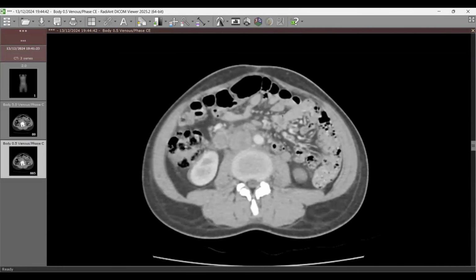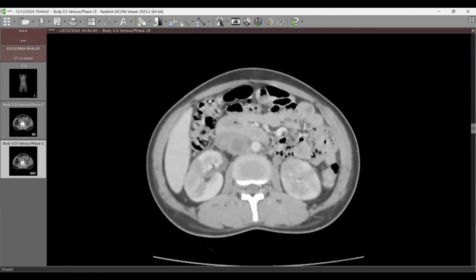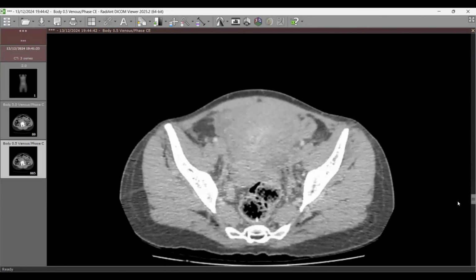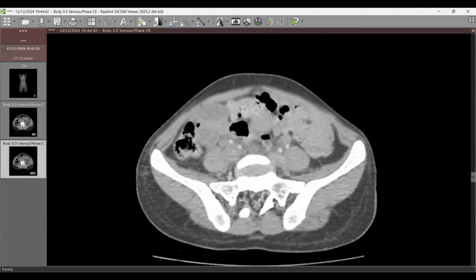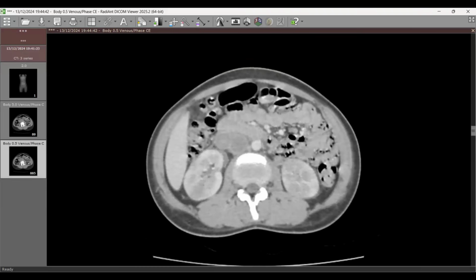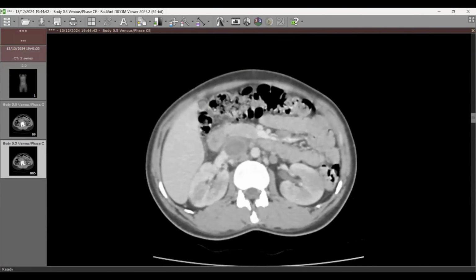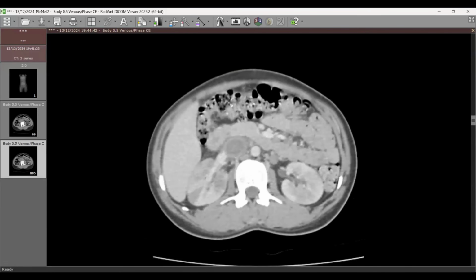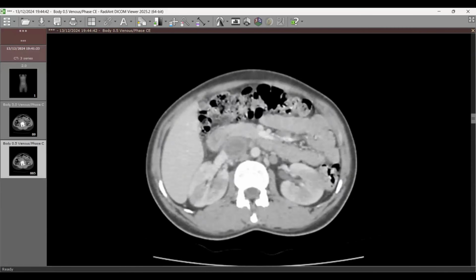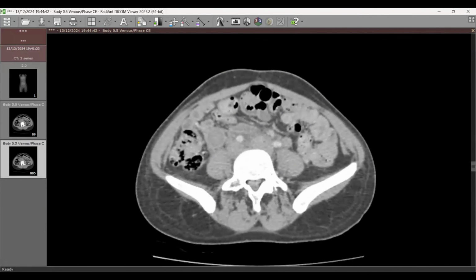You can see it draining into the IVC, and from there the thrombus is traveling into the IVC. The thrombus will not travel from renal vein into the IVC. On the other side that you were seeing was the thrombus in the left ovarian vein. It wasn't in the IVC. Can you appreciate it here? Yes, sir. Now I can. Yes, this is draining into the left renal vein. Can you appreciate it? Yes, sir. So this was bilateral ovarian vein thrombosis.